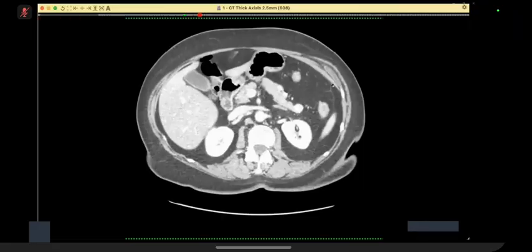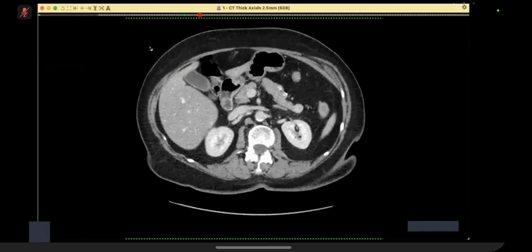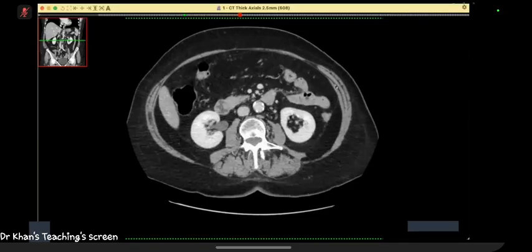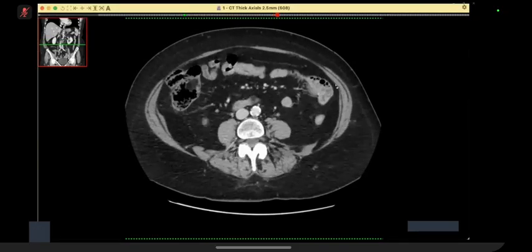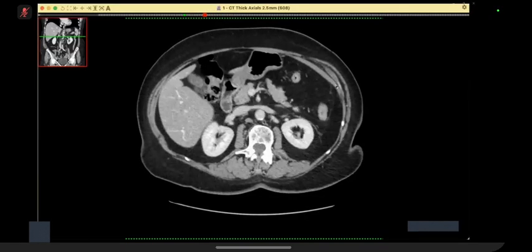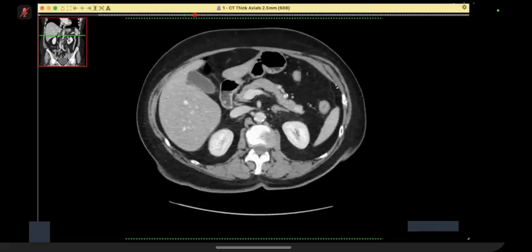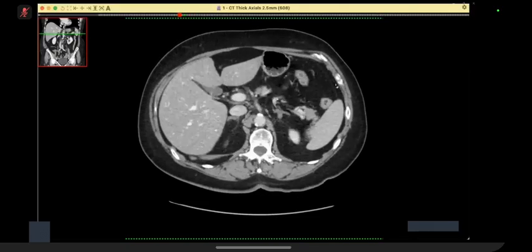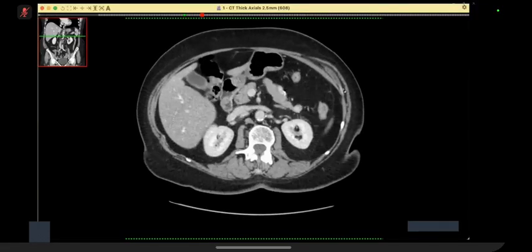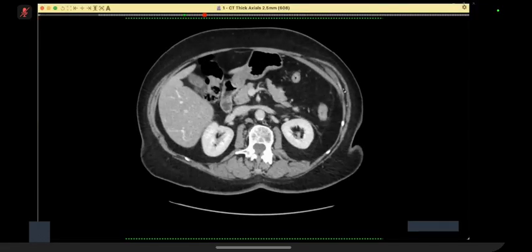Can you adjust the window again, please, Dr. Khan? Yeah, I will make it for you. Here you are. Thank you.